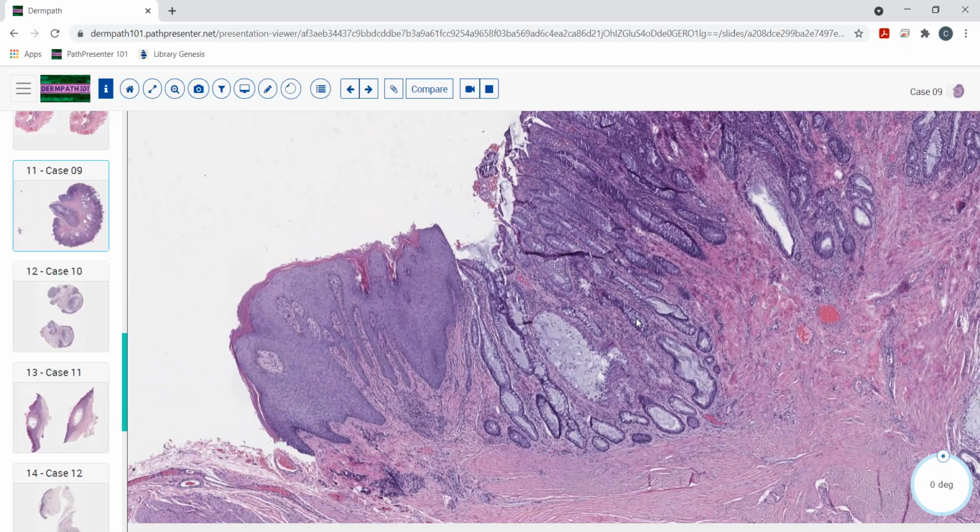Almost, we recently were out in the Joshua Tree National Forest area, and there's two different types of deserts that kind of collide with one another. One's got a lot of rocks and boulders with it, and one's more like a traditional arid desert with a different kind of terrain. This is sort of analogous. You've got two different types of epithelium here that have collided. So you've got stratified squamous, and you've got GI epithelium.